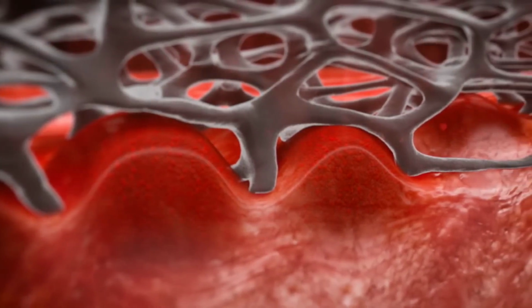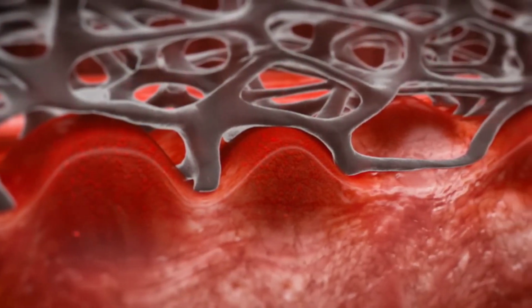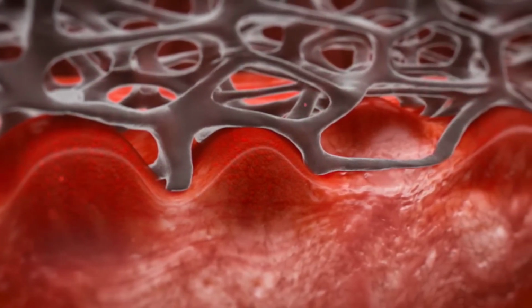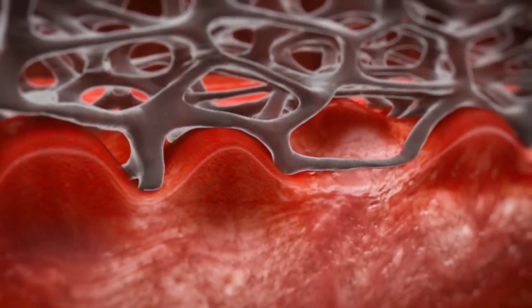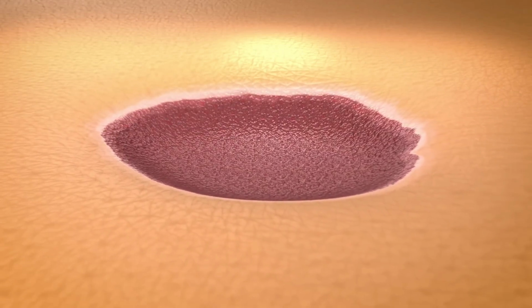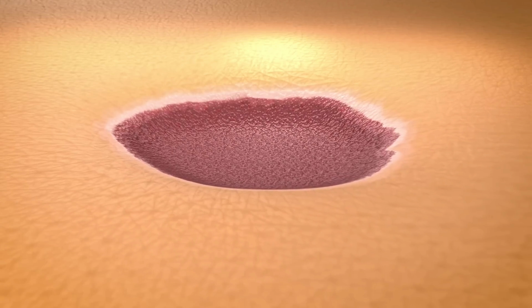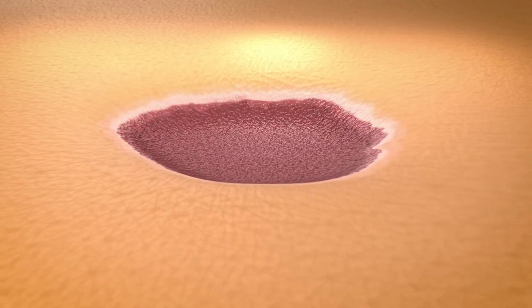All of this activity leads to the formation of healthy granulation tissue in the wound bed, and the characteristic undulations that have been seen in wounds managed with 3M VAC therapy. Over subsequent dressing changes, the granulation tissue fills the wound bed, further reducing the wound volume and preparing it for final closure by secondary or delayed primary intention.